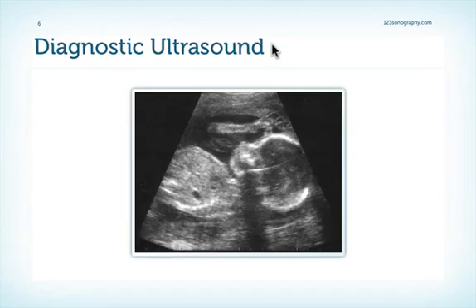And here's a beautiful example of an ultrasound image. You can see again the shape of the sector, a curvilinear array probe, and you can see that there are light and dark areas. The light areas, or the white areas actually, are those areas where we have a lot of reflection, while those which are dark don't. Thereby we can really distinguish tissue from each other. Tissue which has a lot of echogenicity and tissue which doesn't. Do you all recognize what this is? Well, obviously this is not a heart, but it's a fetus. But the same principles apply to all types of ultrasound, no matter where you use it.